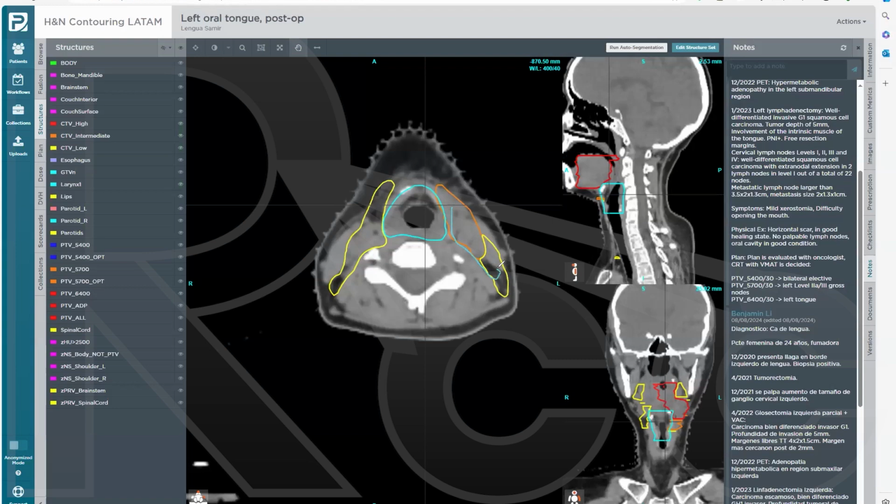Now, if this was surgically not touched, an undissected neck, I would stick to the medial aspect of the sternocleidomastoid muscle and draw, right? But this patient had a neck dissection, a left lymphadenectomy. So then that's where you want to consider covering the sternocleidomastoid muscle like this. Does that make sense? So that's just feedback here.